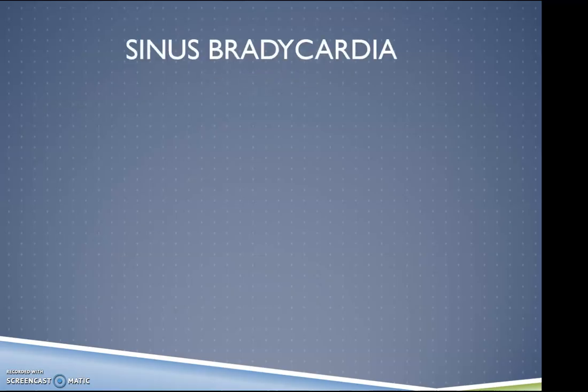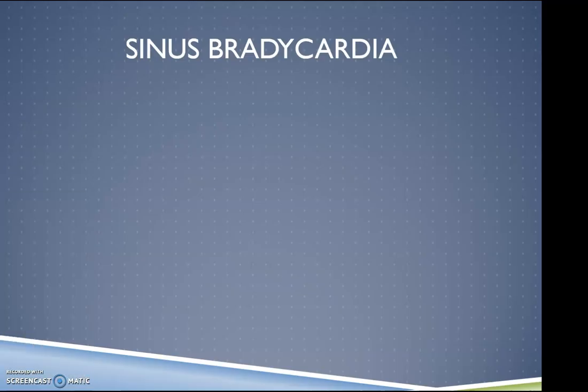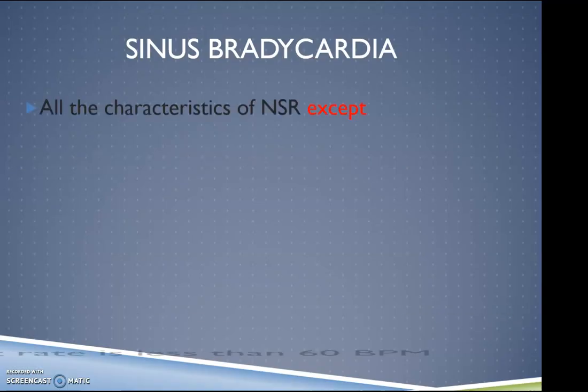Sinus bradycardia. In the last PowerPoint and series of podcasts, we talked about sinus rhythm. Here are the characteristics of sinus bradycardia. Basically, it's just like sinus rhythm, except it has a heart rate less than 60. So all the characteristics of normal sinus rhythm, except the heart rate is less than 60.